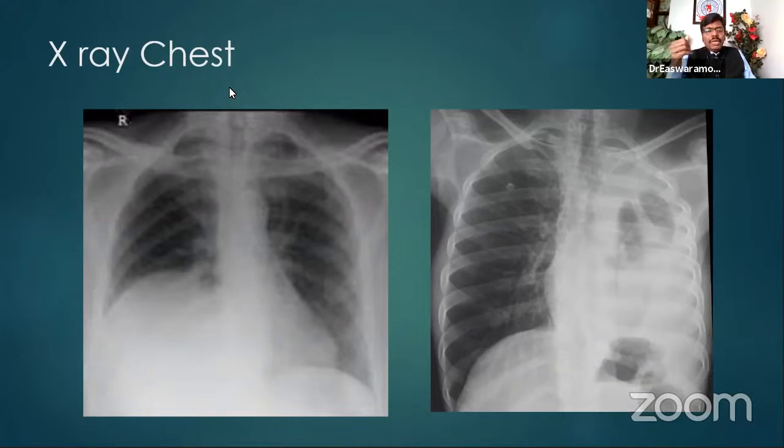The patient presented to the pulmonologist with respiratory distress, that is exertional dyspnea, and on listening to the chest, there was hardly any breath sound, absence of breath sounds on the left side. There was some hyperresonance on the left side, and the right side was okay. He could hear the heart sounds more towards the right side than the left side. So this is the finding they have written, and they sent the X-ray to me.